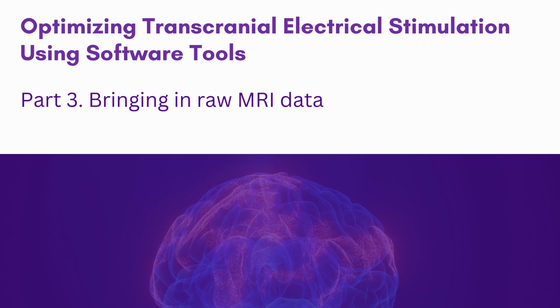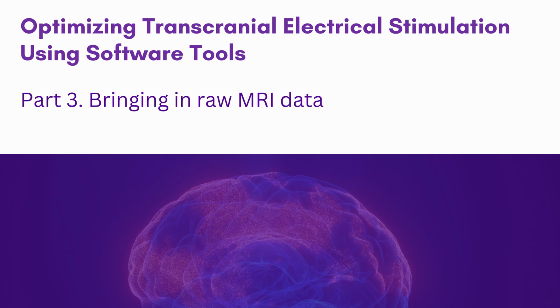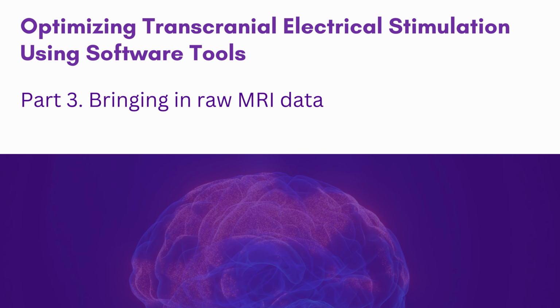Welcome to the third video tutorial in our series on optimizing transcranial electrical stimulation using software tools. In this video, we will delve into the process of preparing actual patient data for import into Zeffiro Interface. Our comprehensive workflow consists of the following stages, which we will explore step by step.